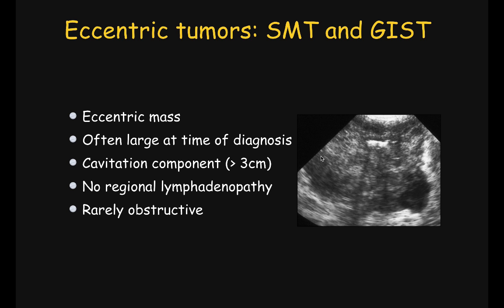This is an image of a very large mass, with an eccentric cavitation within the lesion. The origin of this lesion could be attached to the GI tract only by the presence of a small amount of gas within the lumen of the mass.